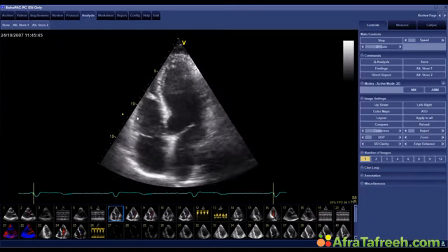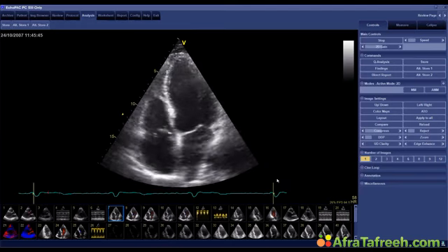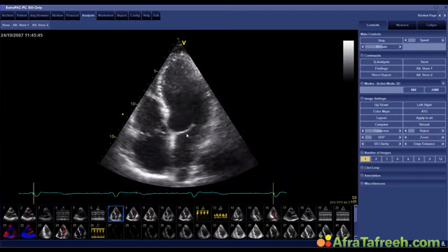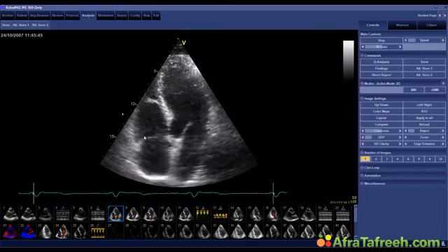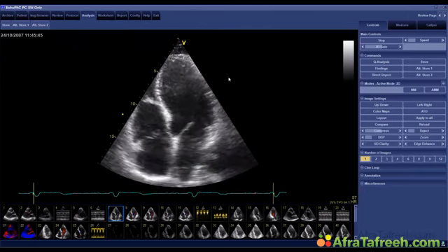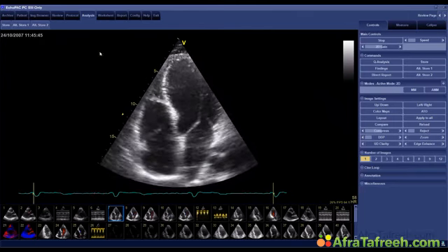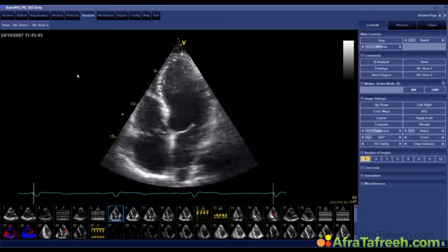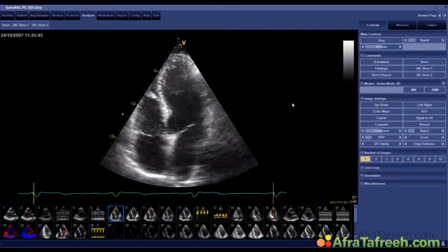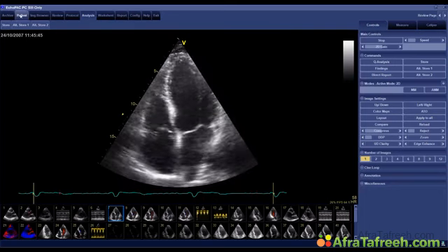The question remains, why does the patient actually have a left bundle branch block? Remember, everybody who has a left bundle branch block should undergo further investigation, not only pilots, but certainly everyone, because you could have coronary artery disease or hypertension or dilated cardiomyopathy. But we don't really know why he had this. He had a recent episode of sinusitis, but he never really had any myocarditis or infection of the heart that was really documented. Okay, but the story is not over.